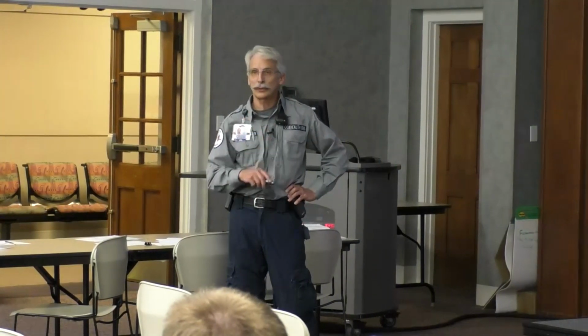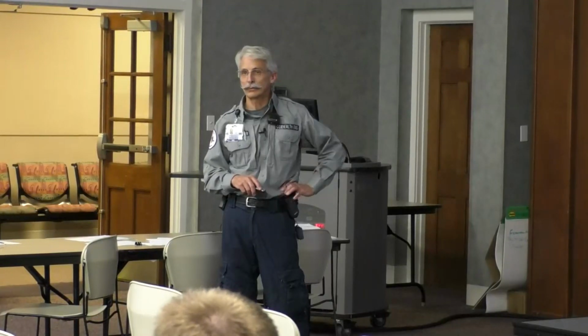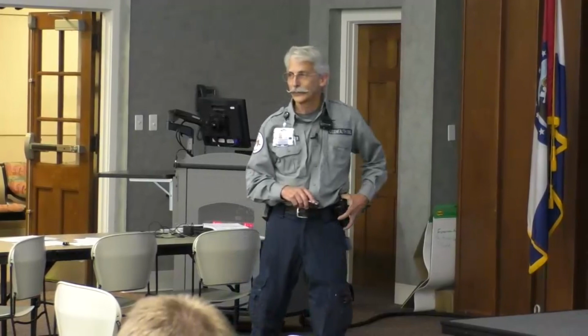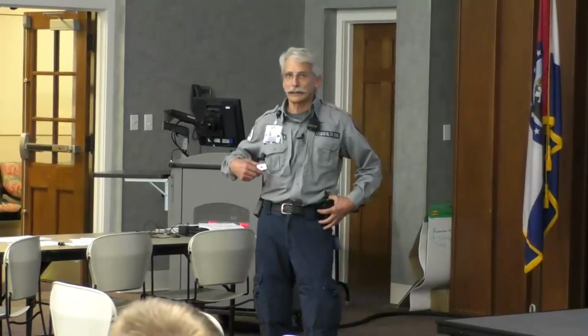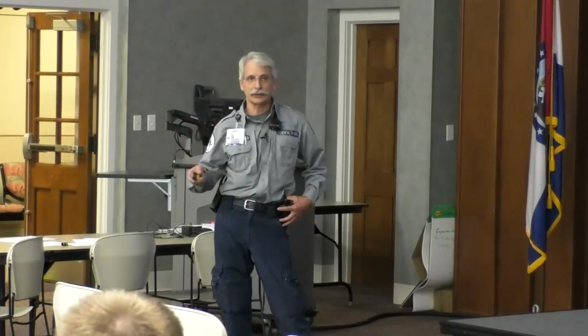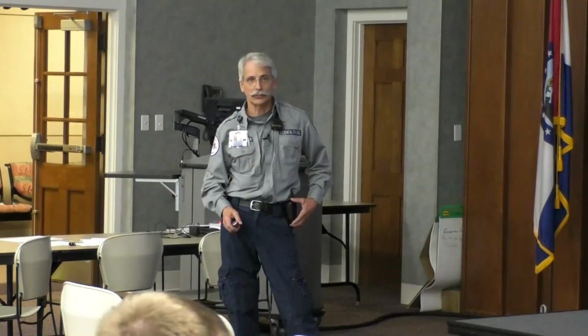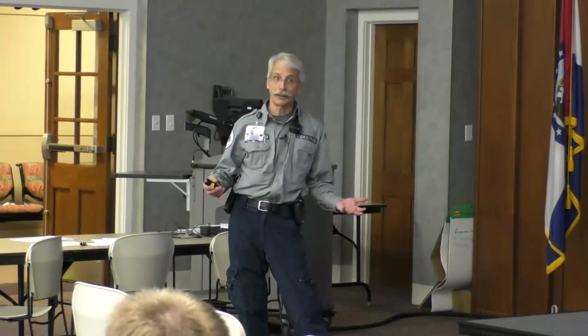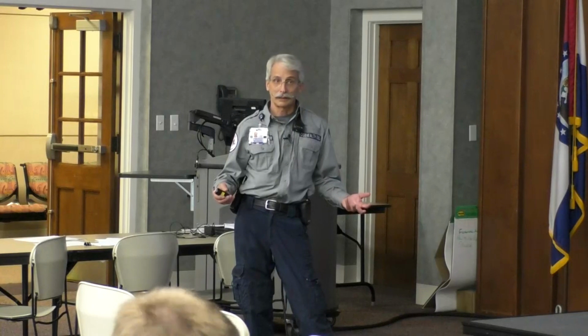So what else should we do to this patient, since we're doing this and we've got 15 minutes to get to the hospital? Now do a right-sided or a 15 lead. Do a 15 lead, yeah. And I don't care if it's just a 13, honestly, but do a 15 lead, all right? Do a 15, because you want to know before you give this patient any nitro, which is part of your protocol, all right?